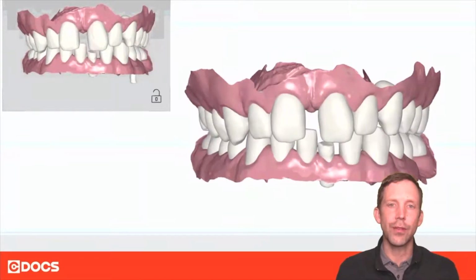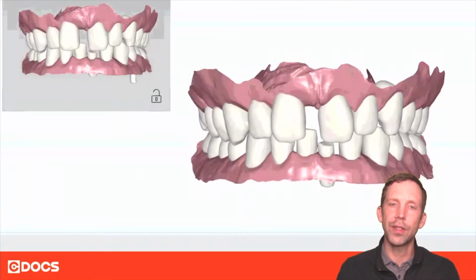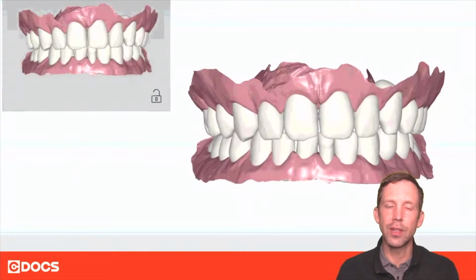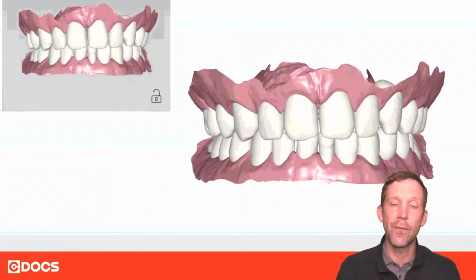So the combination of InLab, just to show the patient what the teeth might look like if you did restorations, compared to the advantages of doing orthodontics. Two very cool strategies to convince the patient or give them value for more comprehensive care.